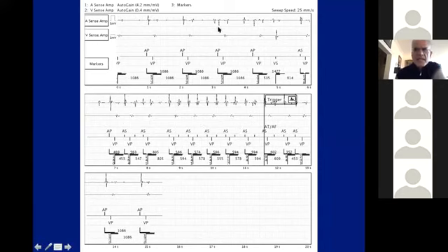You get a sense that AFib is still going on here, even though the device is A-pacing. So this is an example of undersensing during atrial fibrillation, and that's why the device doesn't recognize it and A-paces.